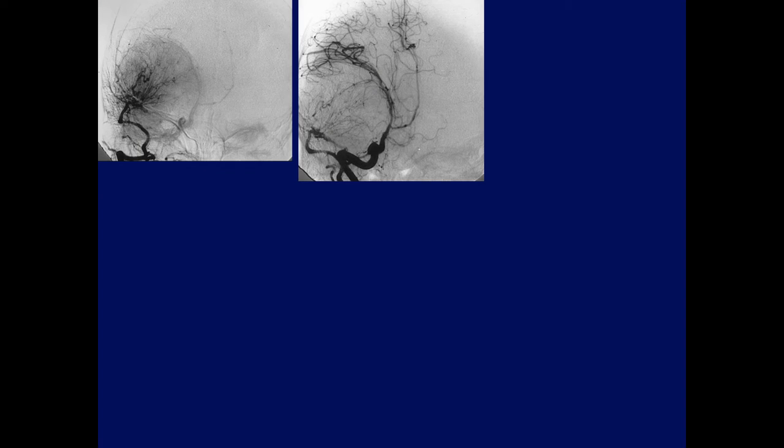What does this old-fashioned angiogram from the old days prior to CT show? Correct.